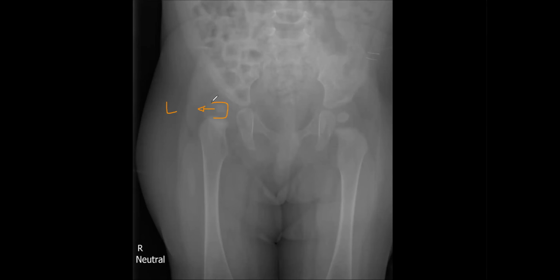And as a size, it's smaller than the opposite one and of reduced density. This is regarding the epiphysis. And regarding the acetabulum, it's shallower compared to this one. And Shenton line is disrupted, unlike the opposite one. So DDH on the right side.